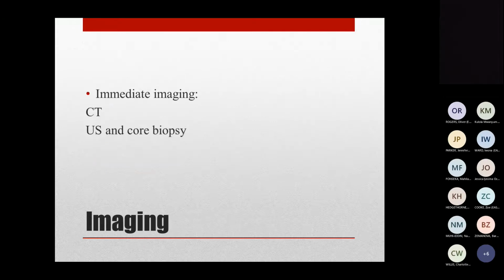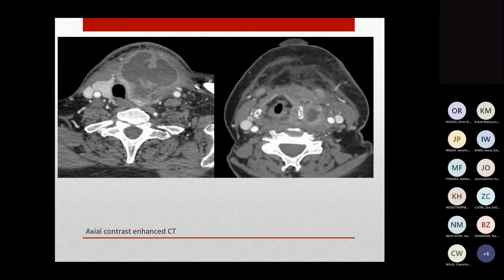The imaging investigations performed were ultrasound and CT, including biopsy. These are axial CT scans with contrast, which were performed at the level of the hypopharynx and at the level of the thyroid. You can see that there's a very large rim-enhancing collection here, which extends from about the mid-anterior neck at level 3 down to involve the left lobe of the thyroid gland. It bulges the strap musculature, and there's overlying subcutaneous fat stranding. It would be compatible with an abscess.